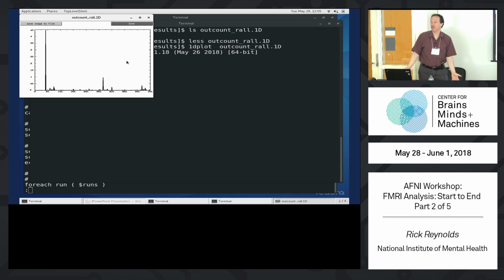You don't have the data. That's garbage. That's why we'll censor it, hopefully. But 3D volreg is going to align that to the base volume. Are the motion parameters going to show a big motion there or not? I don't know. If most of the slices are okay, maybe it doesn't look like motion at all. If many of the slices are bad, maybe it will rotate the thing and you'll see motion. But you can't necessarily predict that. But you will see outliers.